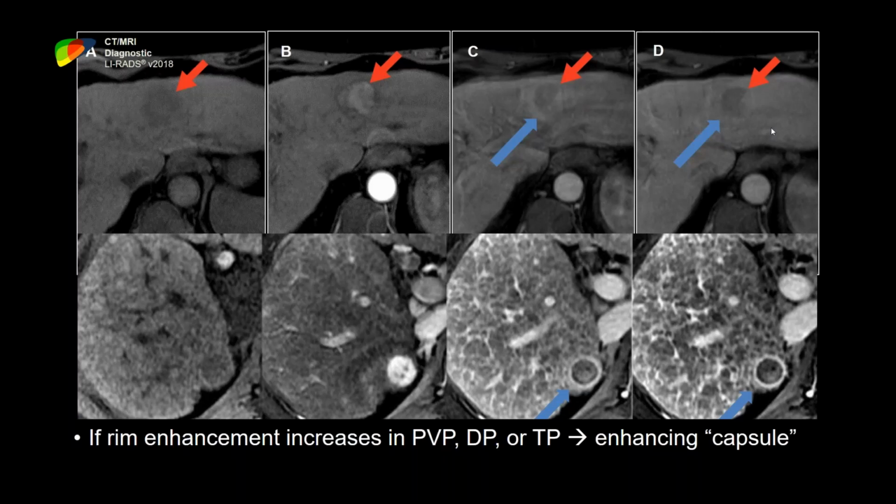How to evaluate washout in case of severe hepatic steatosis? Victoria, would you want to answer this? Right. This is also a fantastic question. Sometimes it's difficult, and sometimes you need to do some interesting things like doing subtraction images. Sometimes we've actually created curves, just like you would for prostate or breast.